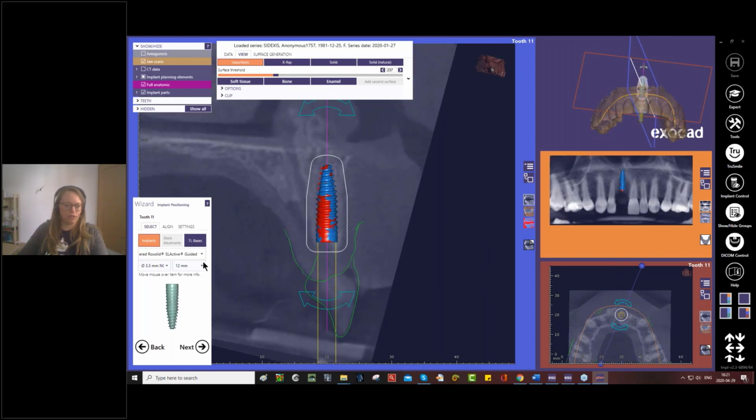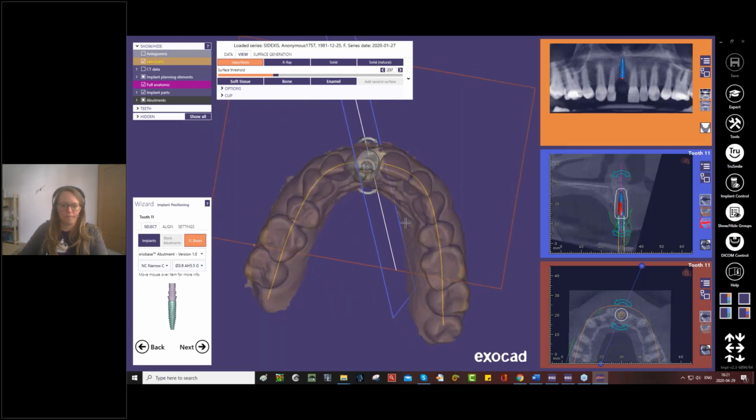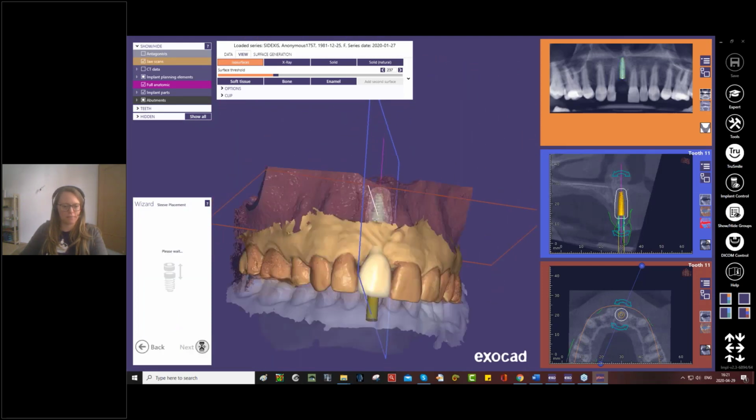And if I want to, I can also place a tie base. They have the libraries. So let's choose one here. And maybe we'll take this one. A little bit longer, maybe. Yeah, let's take that one. And I'll check again at the model. Yeah, all right, keep it like this and continue with next.